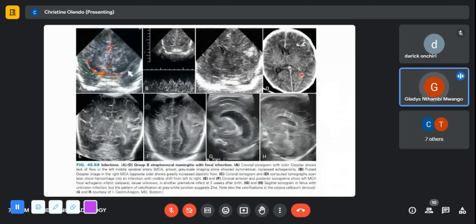The CT has also added something which is not shown on this ultrasound unless one did axial images through the squamosal temporal bone. What has the CT added? Is there anything extra-axial? No, for this image, it was just showing the midline. Have you looked at the image and seen? The only thing that I noticed is this. Yes, there's some extra-axial collection. There's something there, yes.